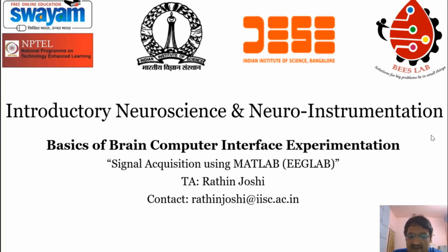Then we will see that this EEG file is recorded in different formats across different systems. So we will see a couple of examples of how different files can be imported or loaded in MATLAB using scripting as well as using a GUI of EEGLAB. So let's talk about EEGLAB a bit before I demonstrate some of the very basic things about EEGLAB.